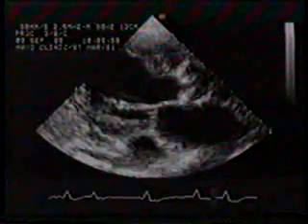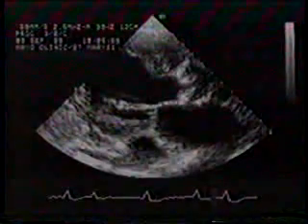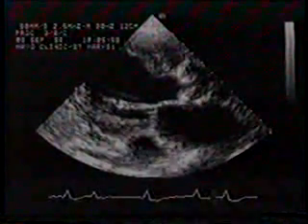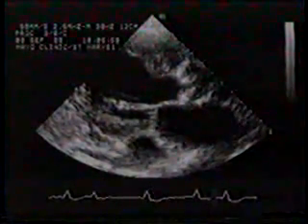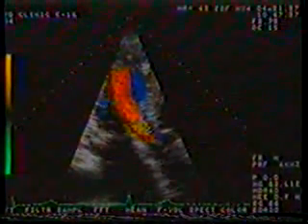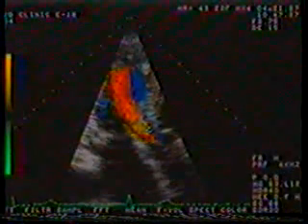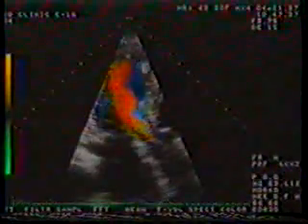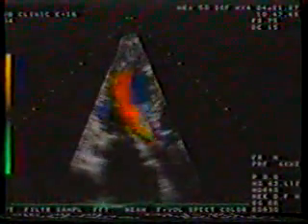On this tape, we have described the comprehensive echocardiographic assessment of aortic valve disease. For patients with aortic stenosis, meticulous application of the 2D and Doppler techniques that we have discussed will allow you to accurately determine the pressure gradient and the aortic valve area. For patients with aortic regurgitation, the integrated approach we have described, incorporating 2D, PW, CW, and color flow information, will allow you to accurately characterize the hemodynamic severity. Therefore, it is only a small minority of patients with aortic valve disease that now require invasive assessment of hemodynamics for clinical decision-making.